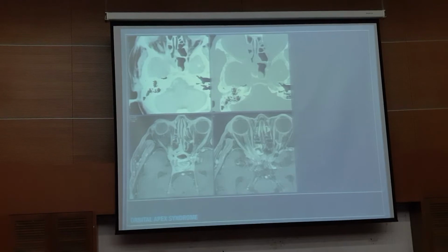This soft tissue at the orbital apex will cause the expected symptoms and signs that you see in this condition. I'm often asked whether this is tumor, which is sometimes very difficult to say, but most of the time it is an infective lesion in my limited experience.